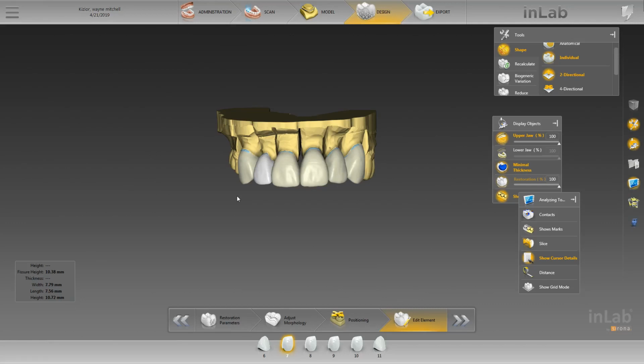This is not a simple or easy case, but there's no fun in only displaying simple and easy cases. Something like this, I feel like you'd be able to get a lot more out of, and you guys watching may get a lot more out of seeing what kind of techniques to use to make something like this look good.